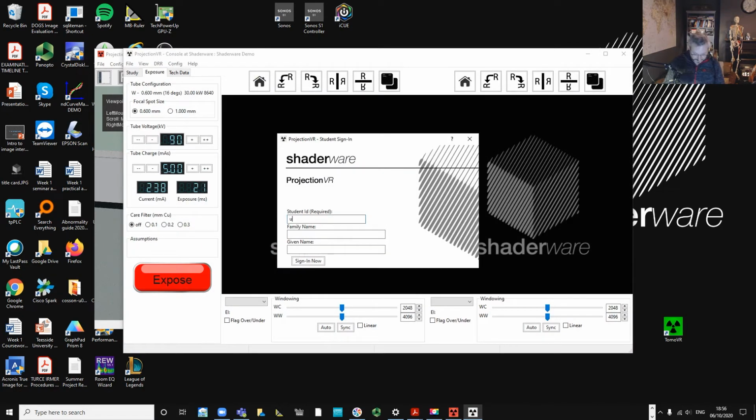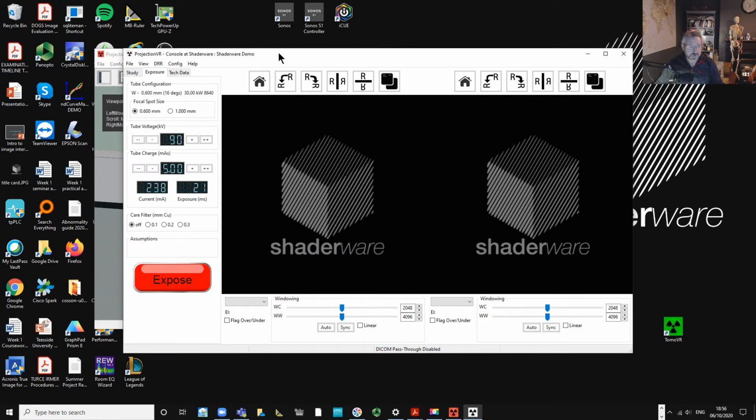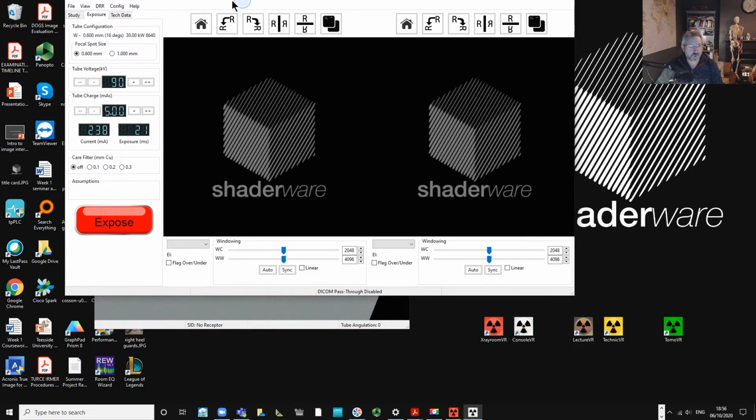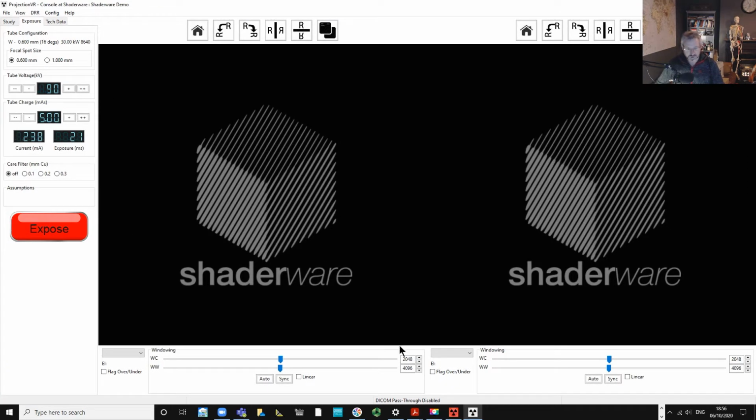And we'll put our username in here and sign in. Okay, so I'll make that large.